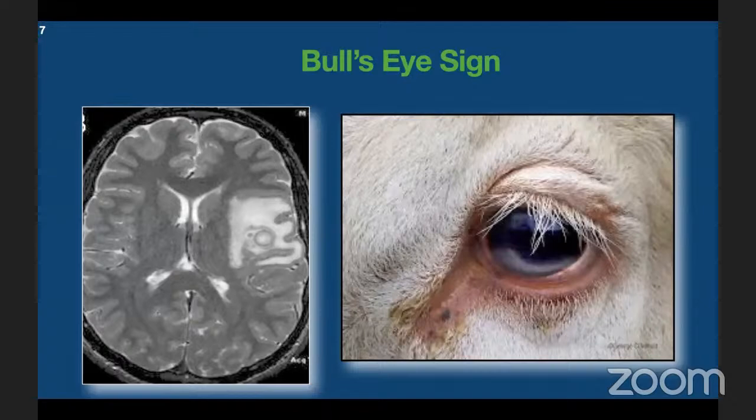This is another bullseye lesion representing a brain abscess as a complication of chronic suppurative otitis media. The peripheral rim is isointense in both T1 and T2, showing a smooth and regular wall. The interpretation must be in the clinical context. We can also see moderate perilesional edema. But in regressing hematoma, there is no or very little perilesional edema, especially in subacute setting. Again, it has to be interpreted in specific clinical context.